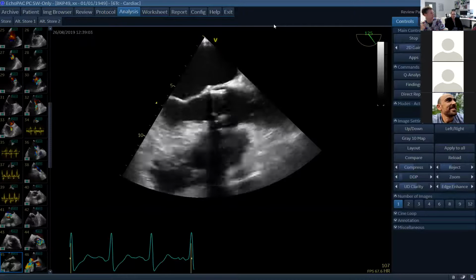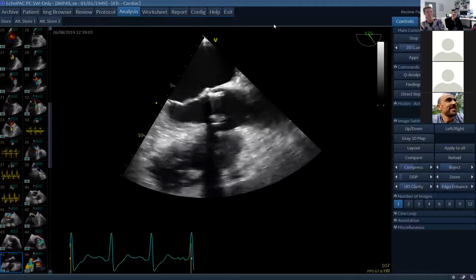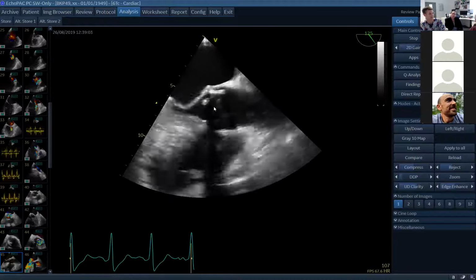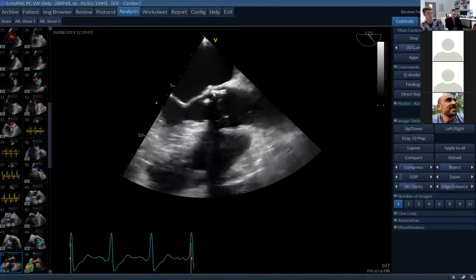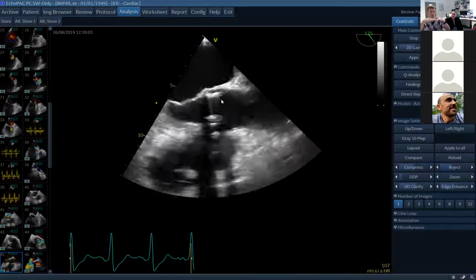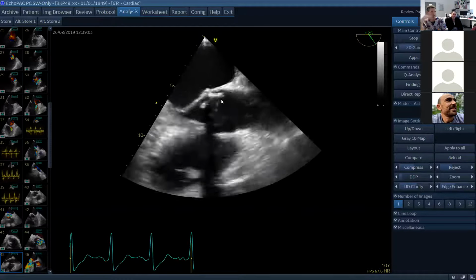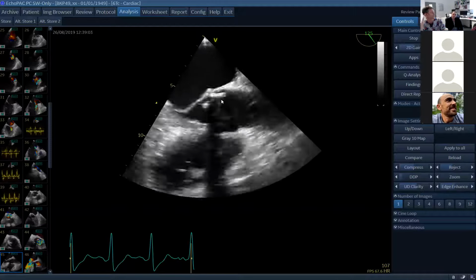All we've been told is query AR. They've got an aortic valve replacement. Query dehiscence. Fantastic. So it's off center, as in it's oblique. We don't actually know what is going on there because we can't see it because of the metal struts. Remember, you've normally got those 3 metal struts with some kind of pericardial tissue making up the valve, and then something is flicking through. That could be a valve, it could be infection, it could be whatever, but it is significantly abnormal.